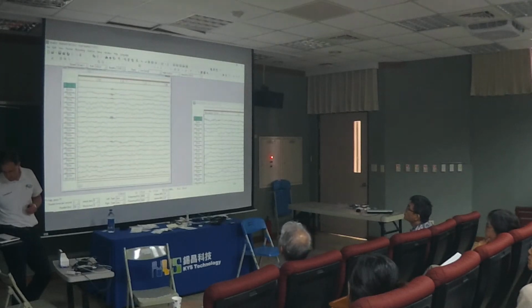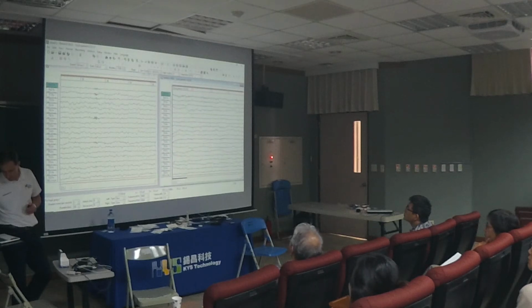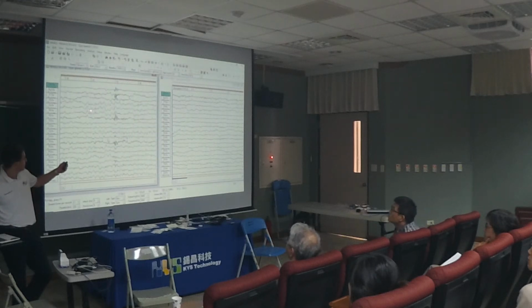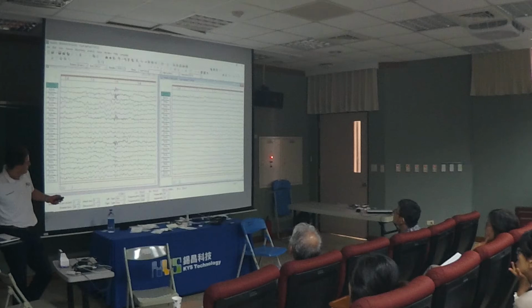This is case number one, map number one. This is map number two. All right. So I want you to focus on the FZ area. See the activity right there? Look at this. See that? And I'm going to fast forward. See that? So this is 20 sessions. This is up to 20 sessions.